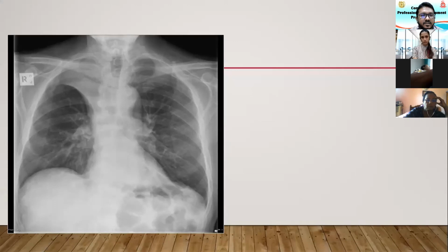The primary lung mass would be a solitary lesion with spiculated irregular margins. But if it is a metastasis, you will have a very nice clear outline. Those are the two main differentiating features, and the numbers are much higher in pulmonary mets. A primary lung tumor will be just a solitary lesion.